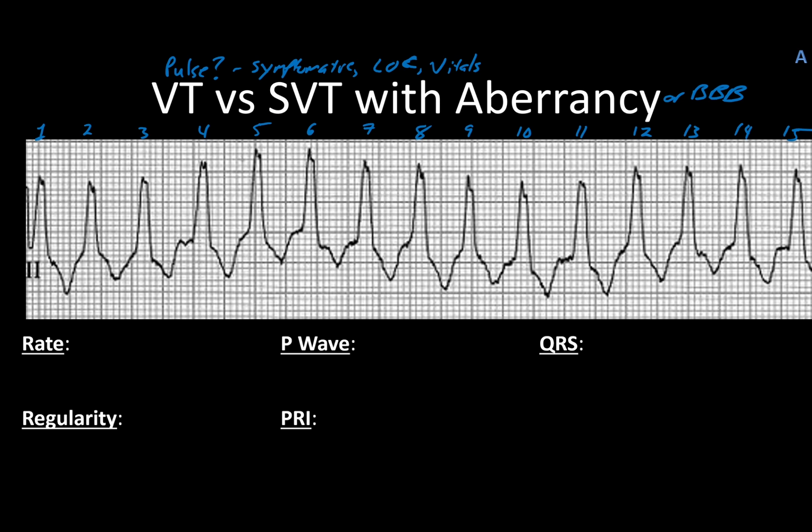But for us, if you have the time, it's important to be able to try and apply all these skills that you've been learning throughout the course. So let's walk through this. I've got a rate of 15-ish, although it's a short strip, so I can't use that. What I can do, though, is measure between 2 and 3.